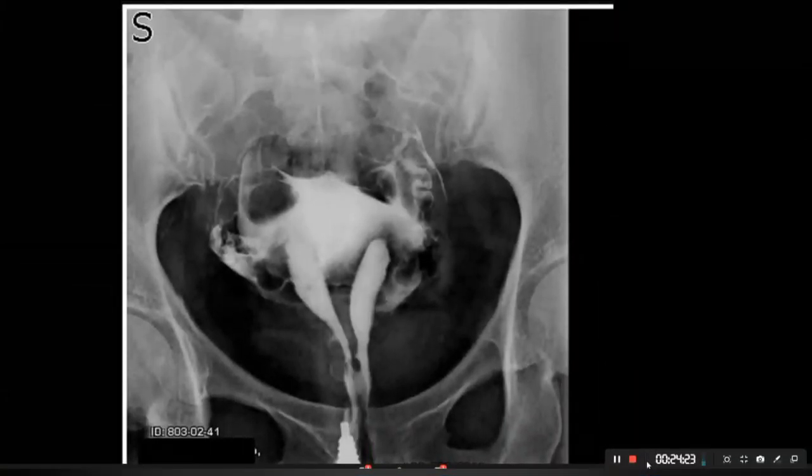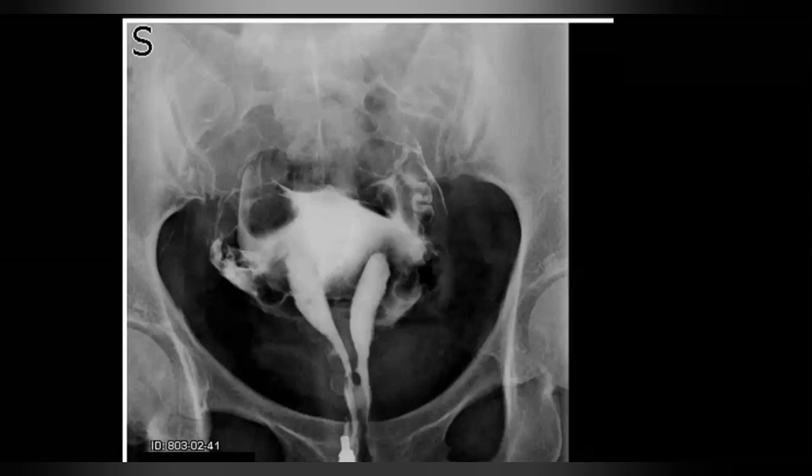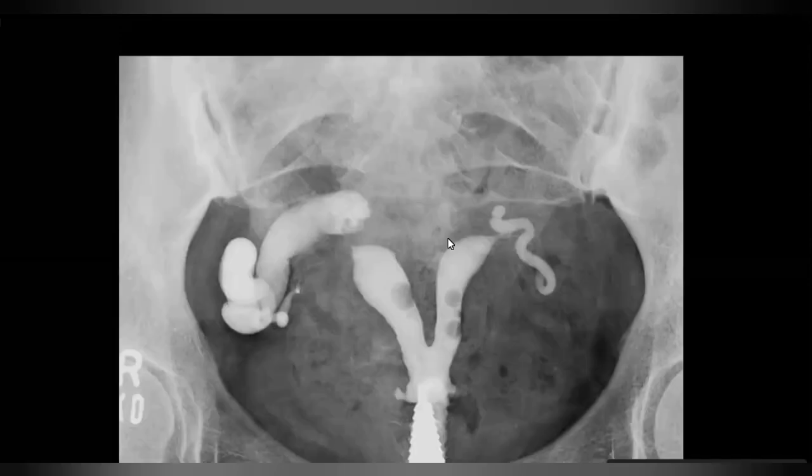Infertility, hysterosalpingogram examination is done. So here we see two endometrial cavities, but the cervix is one, as you see it here. And then the two horns are separated. The angle separating them is less than 90 degrees. As you all know, if the dip is more than 1 centimeter and the angle is less than 90 degrees, then this is due to septate uterus. The tubes are patent, as you can see by the spillage of the contrast.